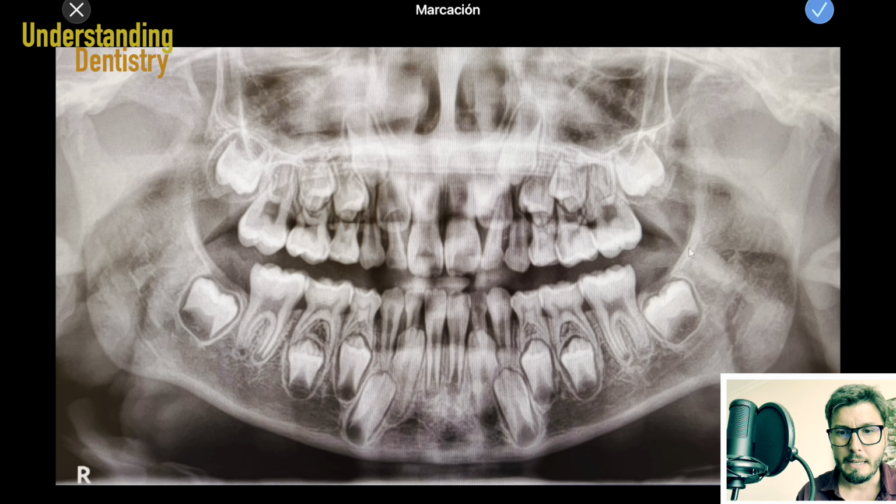All right. We need to understand that not all of them are deciduous teeth. First of all, here we have the germ of the second molar, of course, so the second molar will be here. That's very common. And then this one is already the permanent first molar, all right? So permanent first molars are here. They are bigger than the deciduous molars, so you can actually compare with the molars that are adjacent to those.